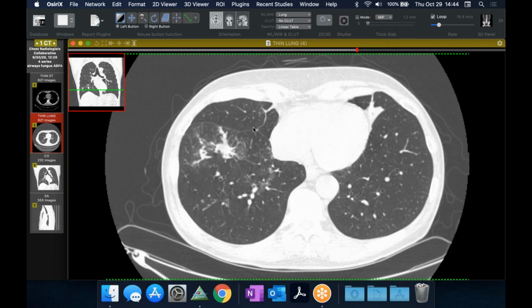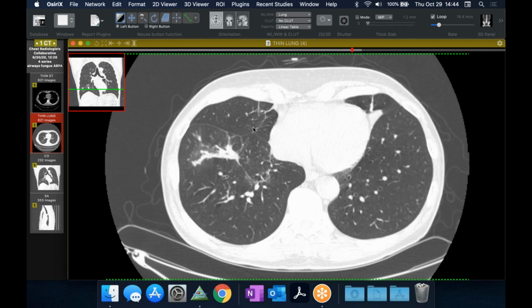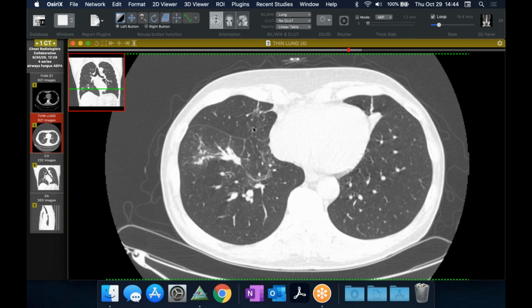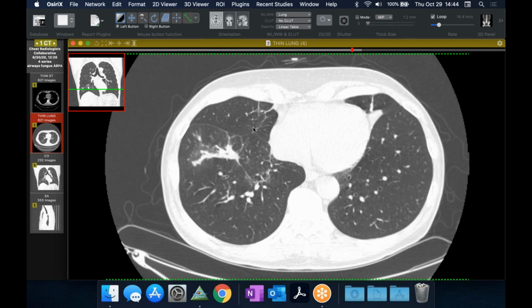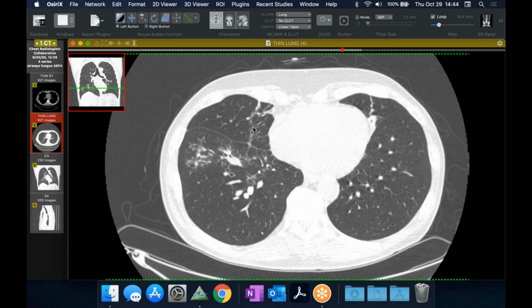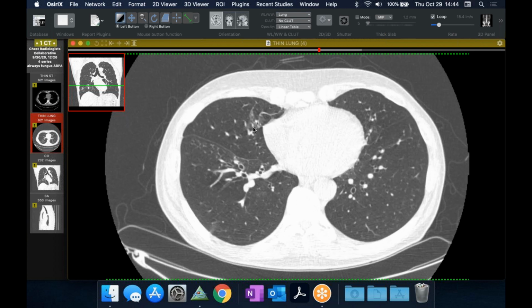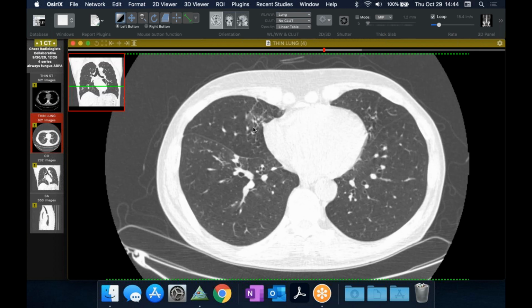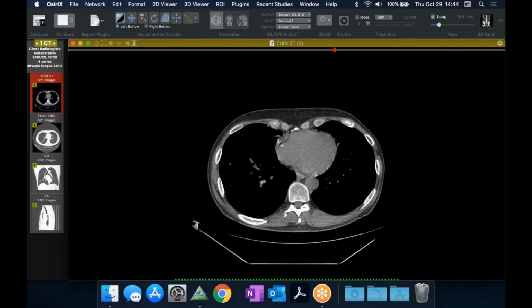How long had that patient been sick for? That's pretty advanced tuberculosis. That TB had clearly been there for some time. Yeah, I don't know. We didn't have any prior imaging of her. Is it possible that the lung is so necrotic that material got into the pulmonary vein and embolized? I've never seen or heard of that before, but I've seen mucor embolize, so I was just wondering if there's any evidence of soft tissue in the pulmonary vein now.